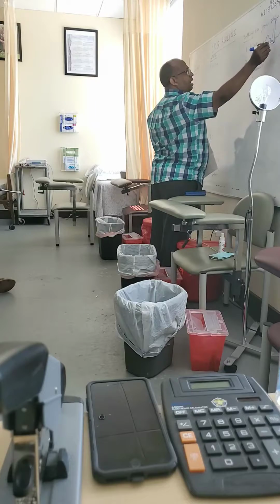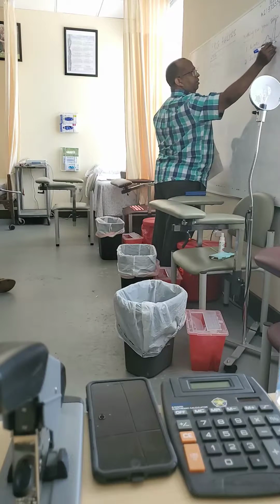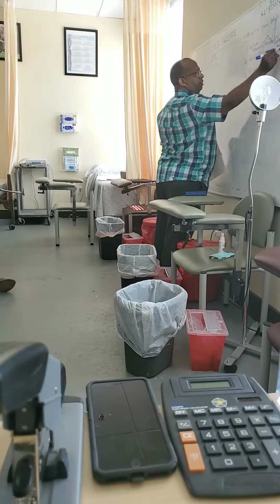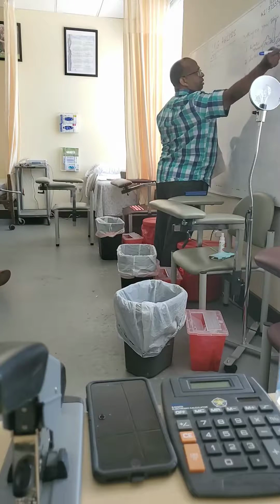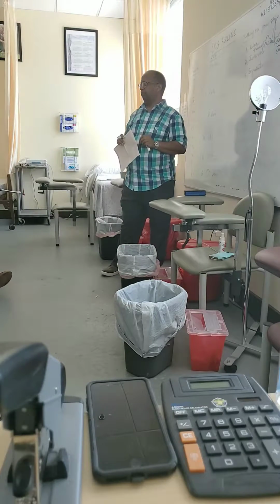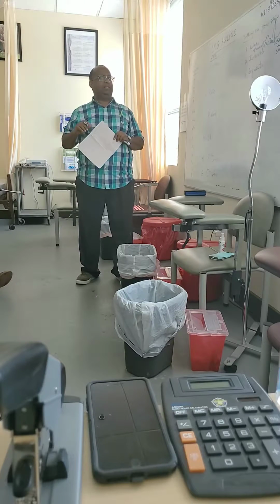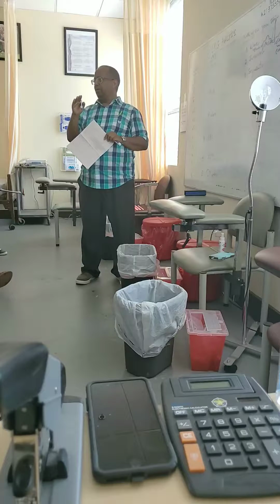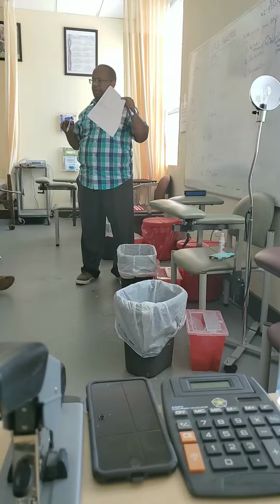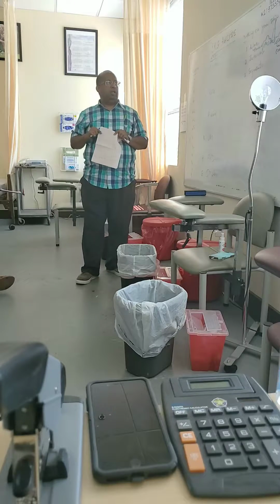The one that's going down is called a downward or negative deflection. So the whole line itself is the zero line, the isoelectric line, and those that go up and down are either upward or positive, or downward or negative deflections.